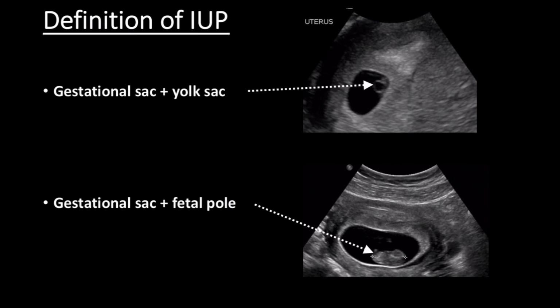Transvaginal ultrasound provides a valuable resource to identify the yolk sac or fetal pole, especially early in pregnancy where these structures are difficult to visualize on transabdominal ultrasound. Identification of an IUP largely rules out the likelihood of ectopic, depending on patient-specific factors.